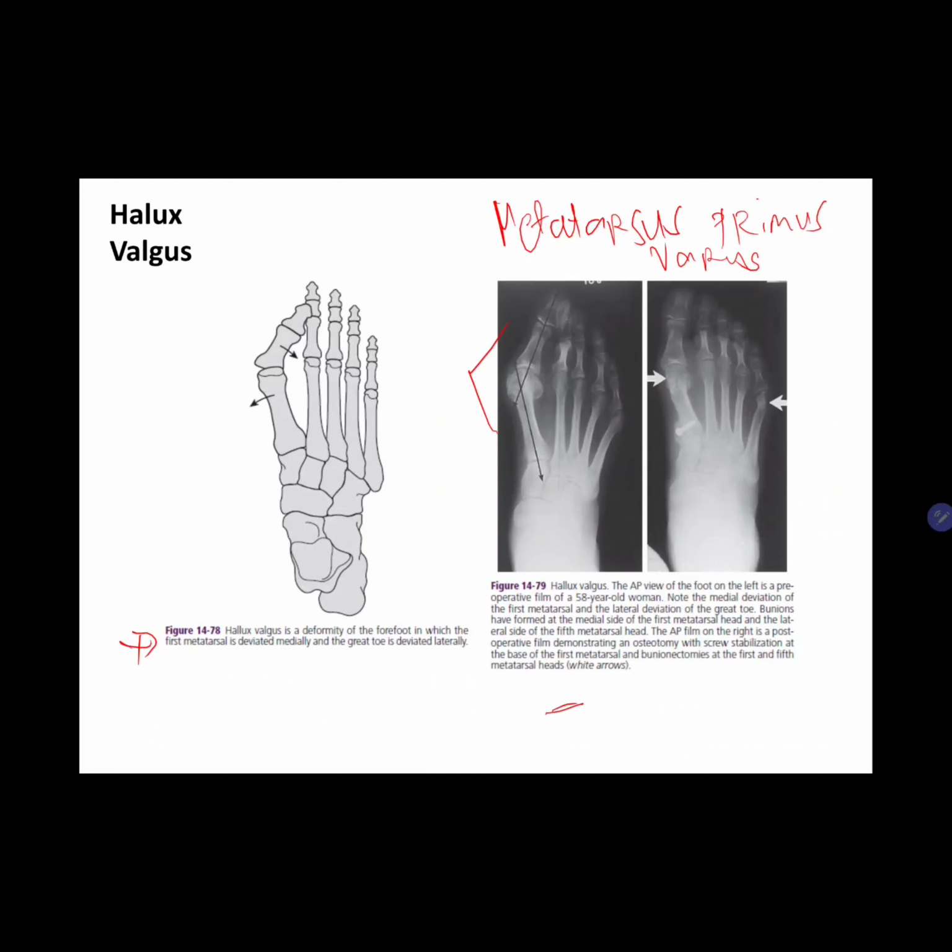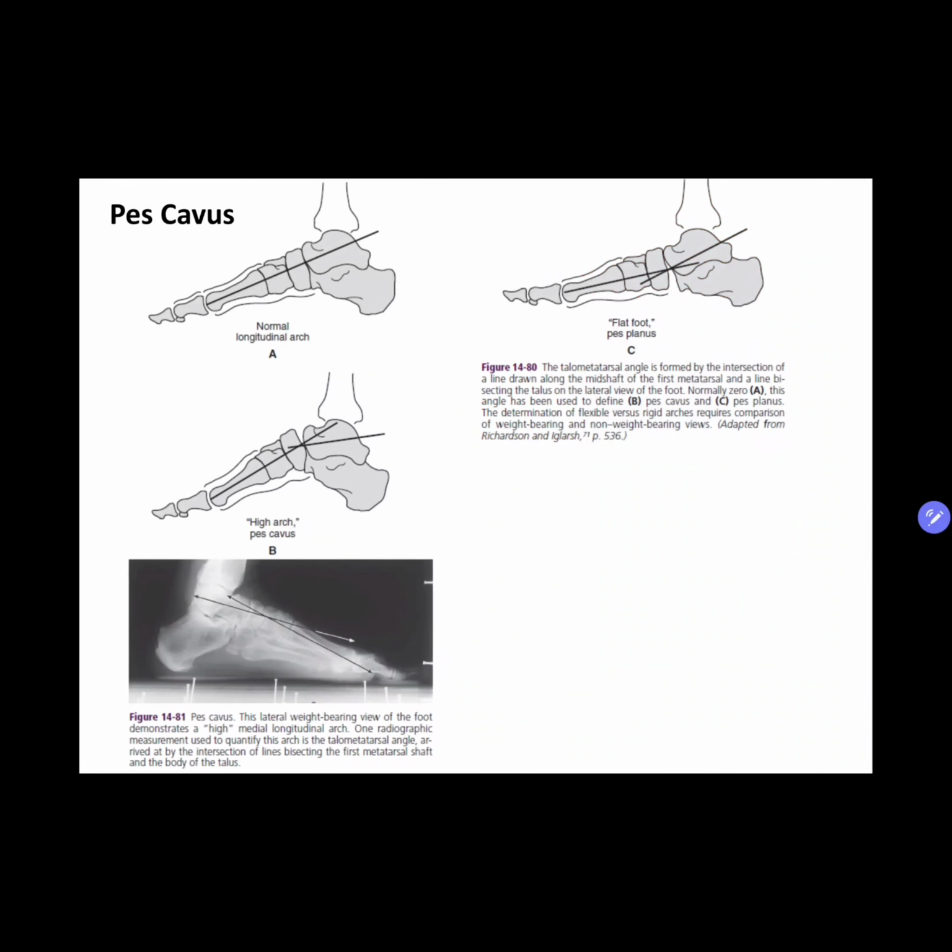So for pes cavus, sometimes called clawfoot, the medial longitudinal arch is abnormally high. So this one here. Alright. The etiology of pes cavus is known in approximately 80% of patients. Conditions include malunion of the calcaneal or talar fractures, sequelae of burns or compartment syndromes, residual talipes equinovarus, or neurologic disorders such as Charcot-Marie-Tooth disease, muscular dystrophy, poliomyelitis, syringomyelia, Friedreich's ataxia, cerebral palsy, or spinal cord tumors. And the other 20% of cases are idiopathic and usually non-progressive.